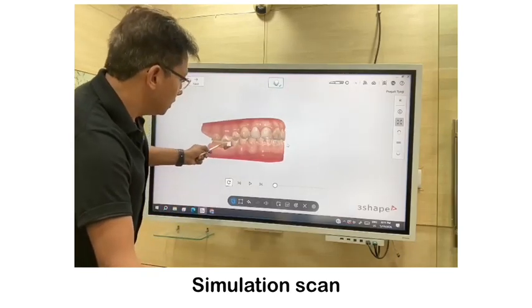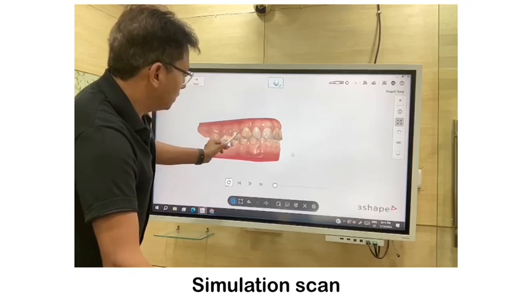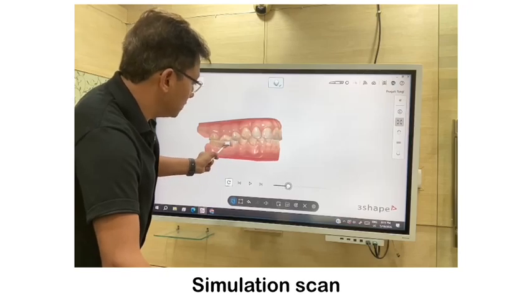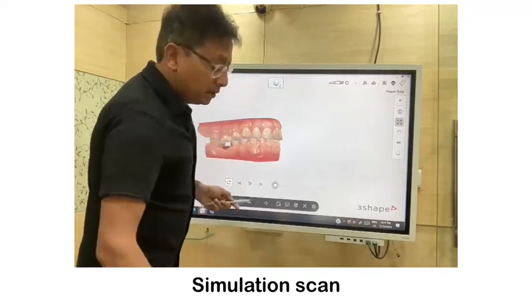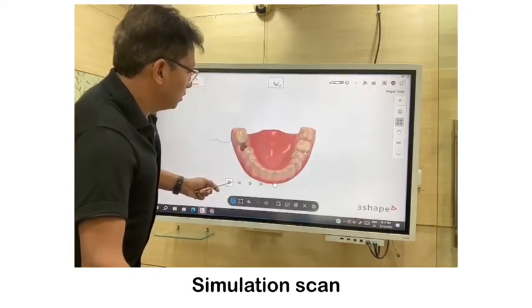So this is a simulation, this is the current status of the teeth which is reached after hit and slide. So what we want to achieve is this, somewhere around here. This is the curvature. These teeth are up, this is down, and this is in a worn state. So canines are worn.